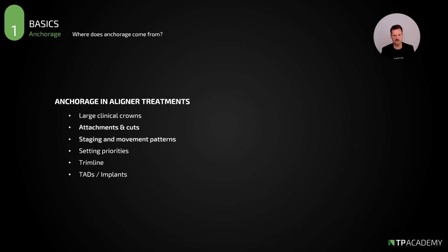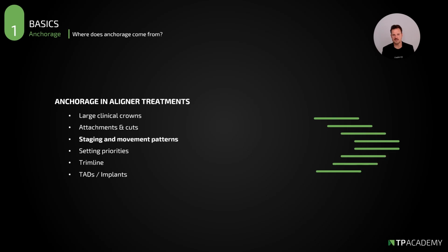Staging and movement patterns. You can see a staging pattern here on the right side. And when I see the staging, I can tell you, okay, it's a semi-sequential movement, 33%. We move more than 2 teeth at the same time. We will go very deep into the staging patterns. I will explain it exactly in detail also for the different software.